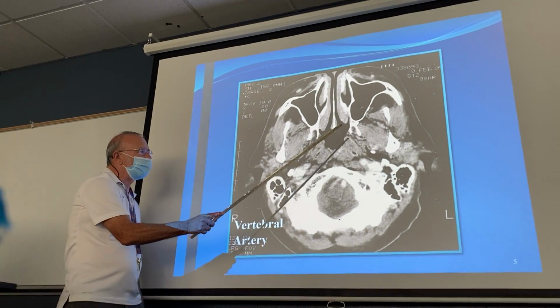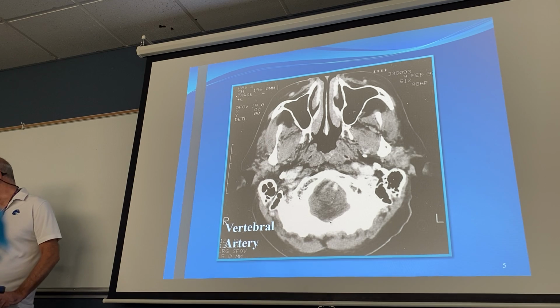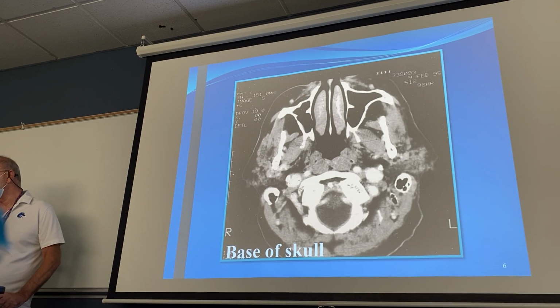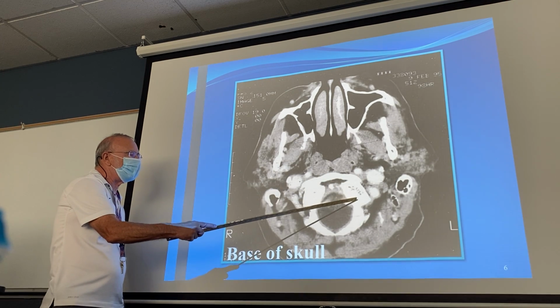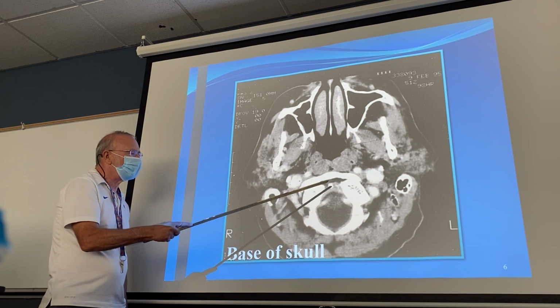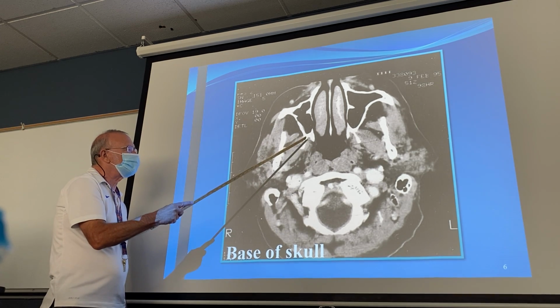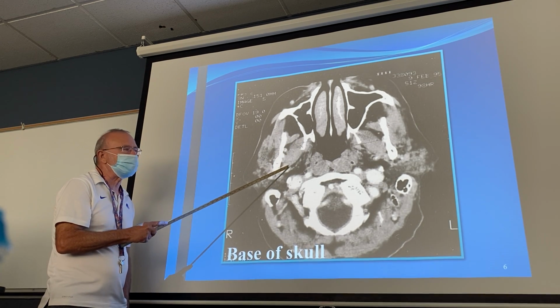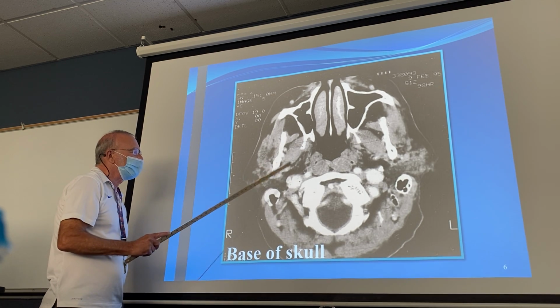For a little bit. Here, of course, is your nasopharynx. And we'll get into facial bones. Actually, we'll start that next week. Okay? Already, we're starting to pick up signs of C1, evident by the anterior arch. Right through here would be probably where you're going to pick up the dens. Here are your vertebral arteries. Once again, lateral pterygoid muscle attached to both sides of the ramus.